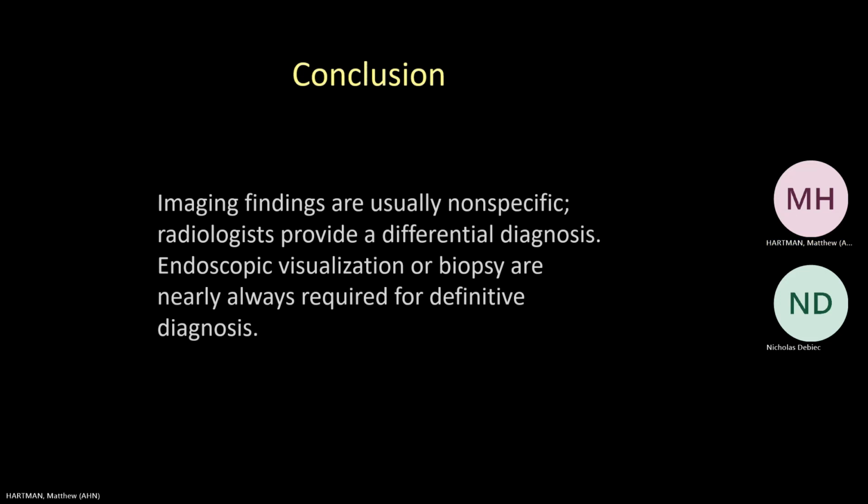And remember, one key thing, one thing where we really add a lot of value with fluoroscopy of the esophagus is motility. And remember that achalasia case. And oftentimes more subtle cases of dysmotility where radiology will really add a lot of value for those patients.